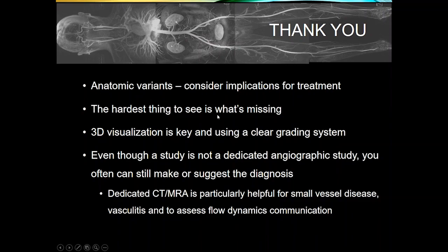Really the hardest thing to see is what's missing, so really familiarize yourself with common anatomy. And also always track the vessels, particularly in high-risk patients. 3D visualization is key to really making a diagnosis in some cases, and also to make appropriate measurements and to assess for more subtle findings. You can get faked out, however, so make sure you use your window levels and use your post-processing accordingly.